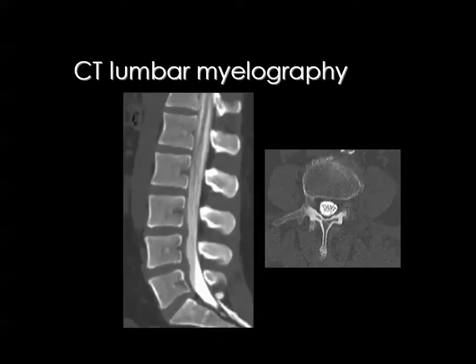After the development of CT, we combined the benefits of myelography and CT by doing this technique which is known as CT myelography. After injecting the patient with contrast and having the routine radiographs for the spine, we transfer the patient to the CT machine, and we have axial sections where you can see the contrast media inside the thecal sac and the nerve roots as dot-like filling defects within the thecal sac.